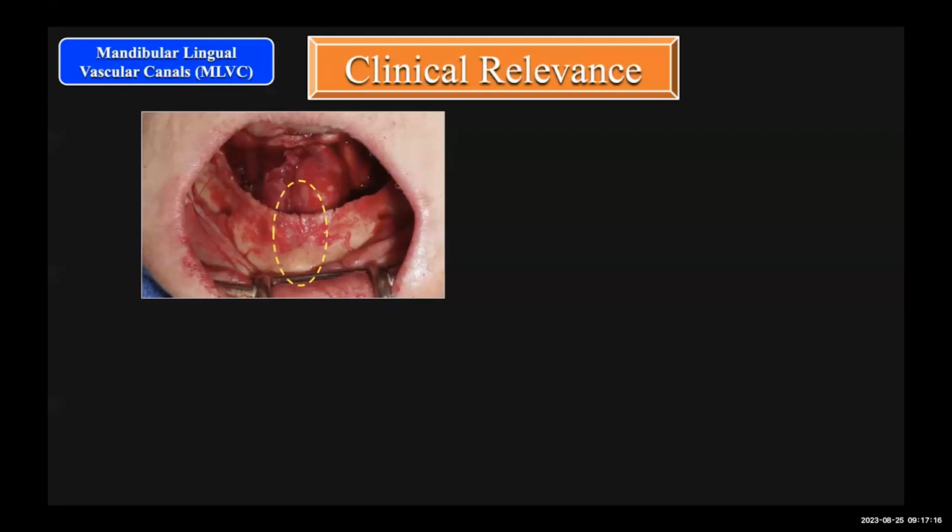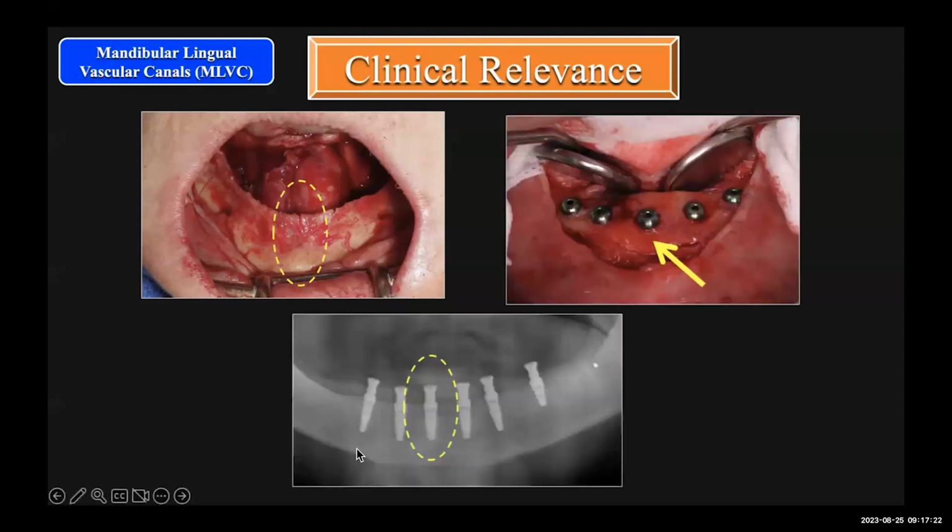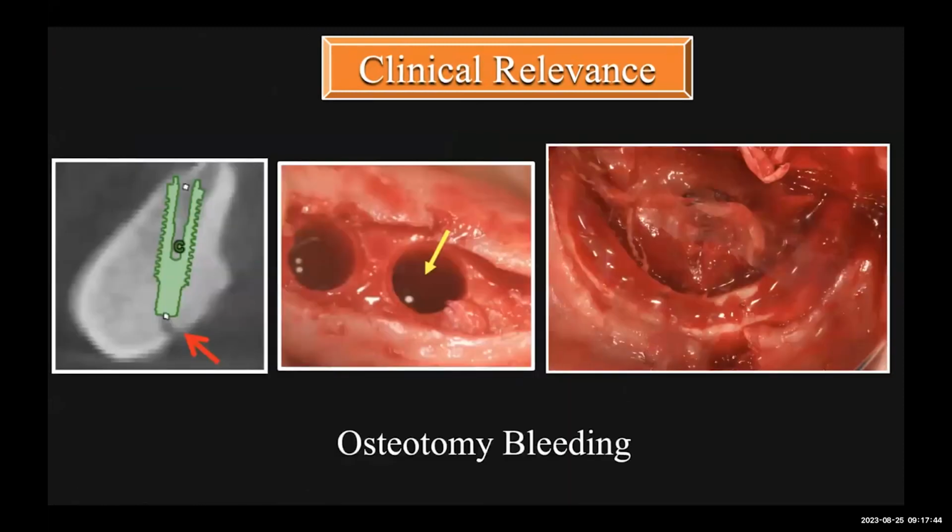So when we do a procedure such as putting an implant in the center position, which we call the C position. Why do we want implants in that C position? Usually to increase our AP spread. So on cases where we're placing 4 or 5 implants in the anterior mandible, we're usually using that center position. So we're right in that same position where this anatomic area is.